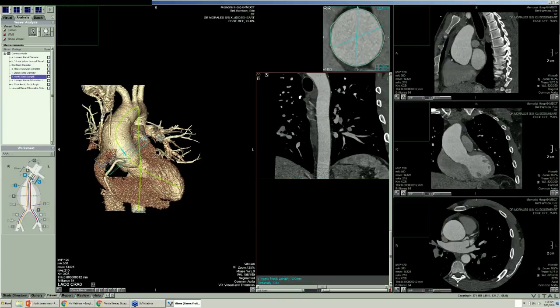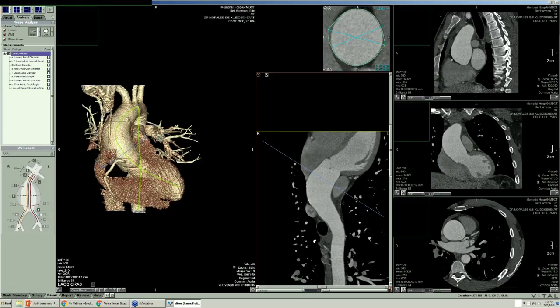And look over here, you can see exactly what we're doing in terms of getting numbers at every level. This is for the abdominal aortic aneurysm that you see there, but we can get all the measures in the ascending aorta and see everything we need to see, and there it is.